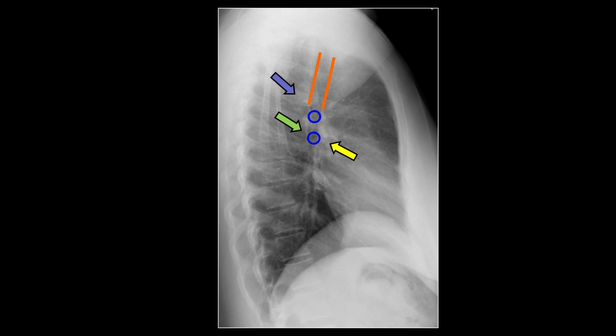One of the important concepts to understand is that seeing the right upper bronchus or the left upper bronchus is not a guarantee in all cases. In some cases, you might see both. In others, you may see none. And in some cases, you might see either one or the other. And that depends mainly on the patient's body habitus and the technique. So if that happens, and if you see one circle, you could not identify the other.